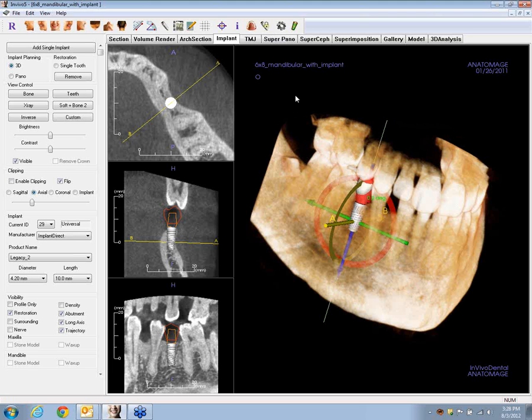That's about all I've got for talking about the InVivo implant placement here today. I encourage you again to tune in the next program where we talk about the actual streamlining and tailor making this work for you by using this preferences setting to customize your own individual implant library and making it really sing for you.